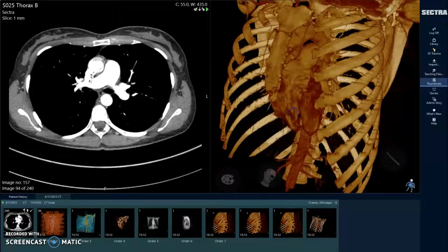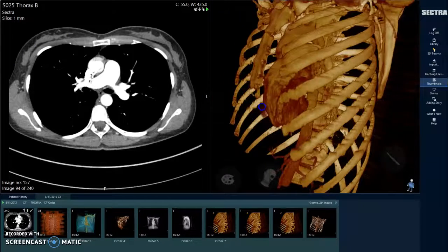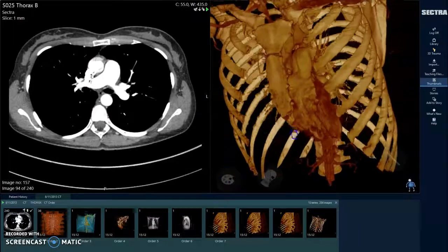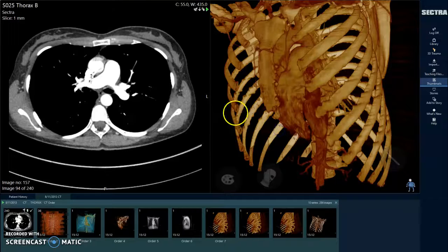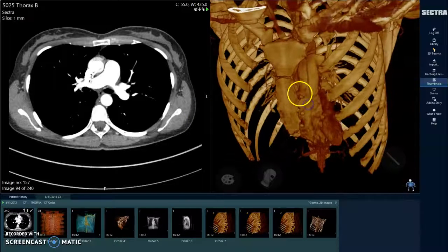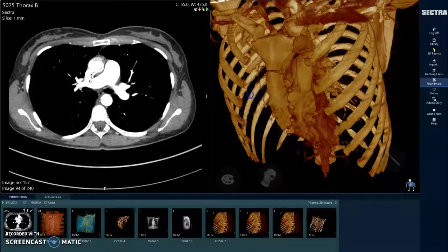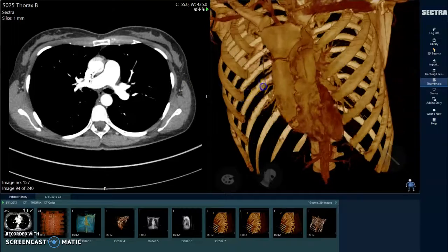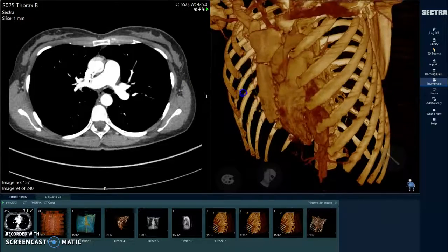So we've got left ventricle there, left atrium there. We've got, sorry, I got that wrong. Right ventricle there. It's got to be left ventricle there. We've got pulmonary trunk coming up here, and we've got aorta arch coming out here, and pretty sure I can see some.